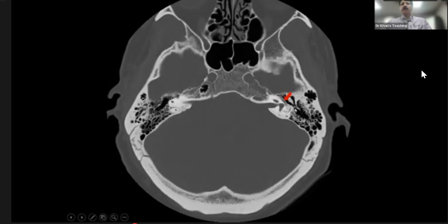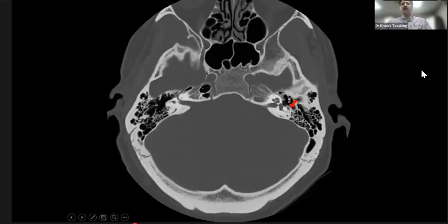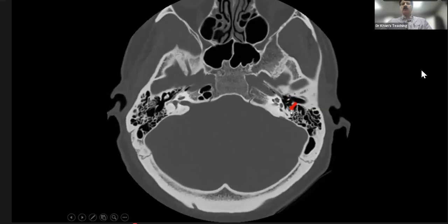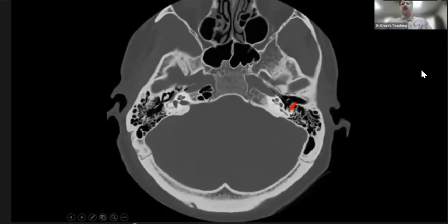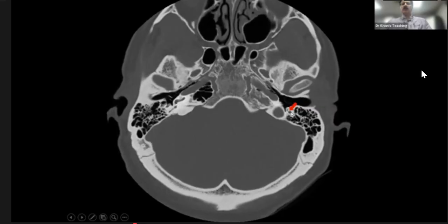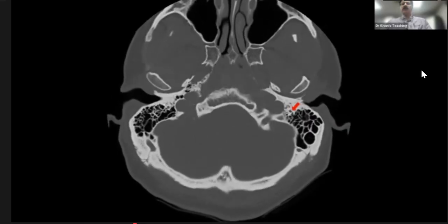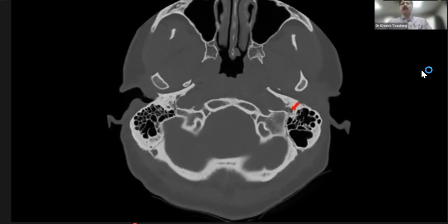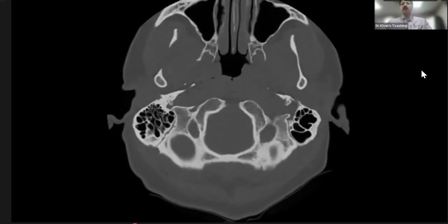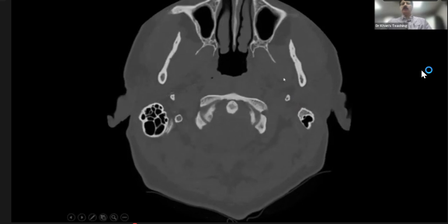This is the tympanic portion. It is going posteriorly. Just concentrate on this, where my mouse is. Now we are going posteriorly, and it is now going to descend down. So it is descending down, and I am going inferiorly where the arrow is, and ultimately it goes into the stylomastoid foramen and then goes into the parotid. You can imagine that the parotid gland must be sitting here.